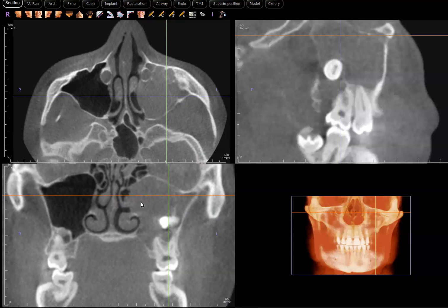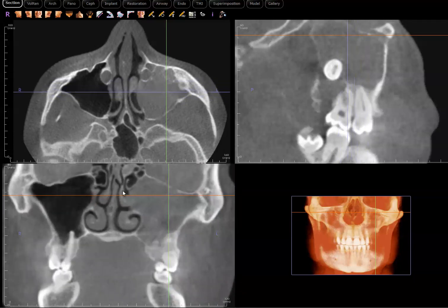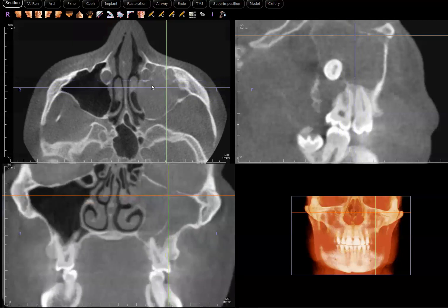But let's look over here. The medial wall is not well visualized. It looks like it's been displaced medially, such that the wall itself is now in contact with the middle meatus, right? Middle turbinates. Okay, the space is the meatus, I think. Yes, middle meatus. That's what the space refers to. Okay, all right.